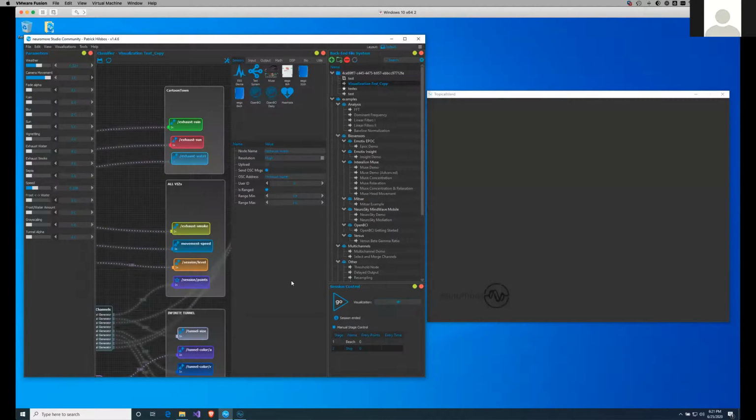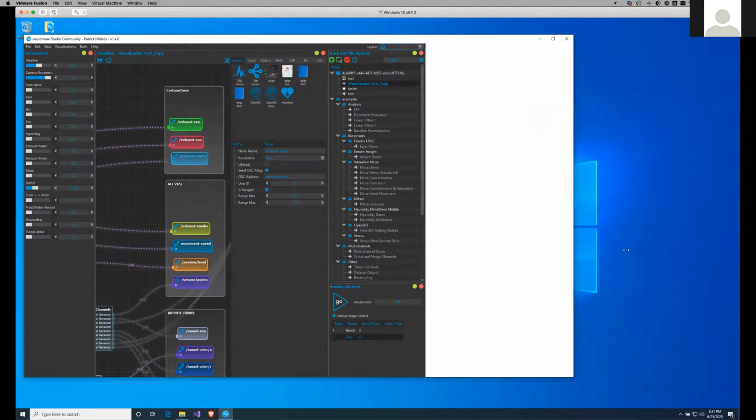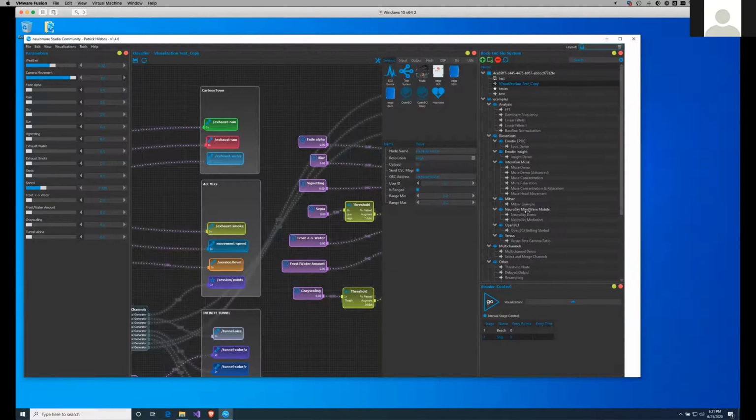All right, now we had a brief look at the different visualizations. And I think now it's time to make them independent from the parameters, or at least to replace some of the parameters with some biodata computation results. So for doing that, let me make the studio a little bit bigger.